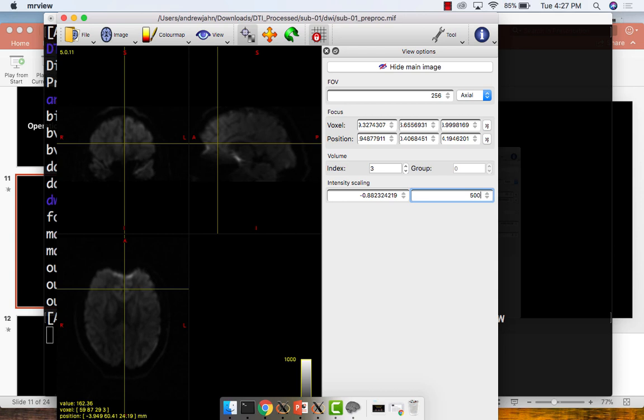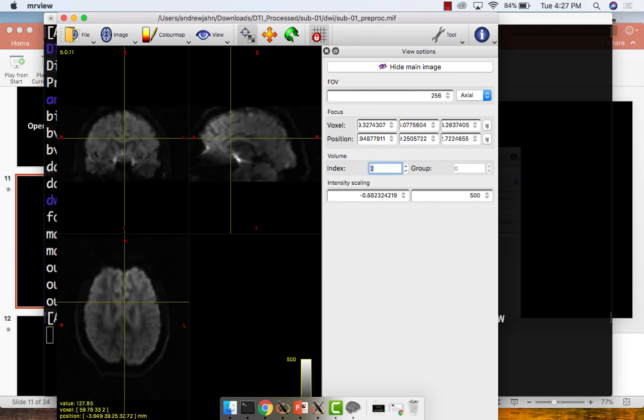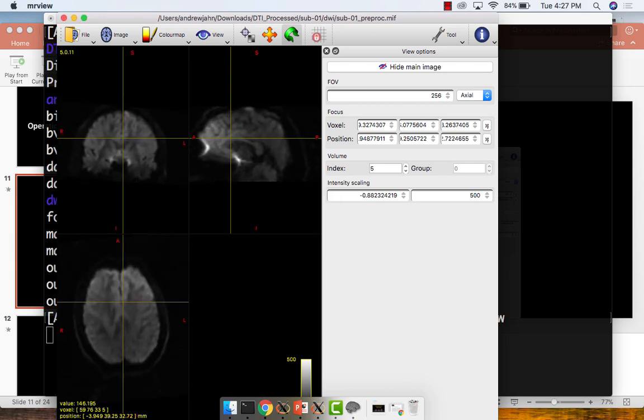This is also a very useful tool to use, where you can change the actual orientation that you're looking at. So you can see these two images over here sliding around. This is important if you want to look at a specific orientation direction, let's say, to make sure that it did the diffusion along that particular direction. If things get too crazy, just press R and you can go back to the normal mode. Okay. So those are the basics. We'll be getting into some more advanced ones as we create more advanced data.